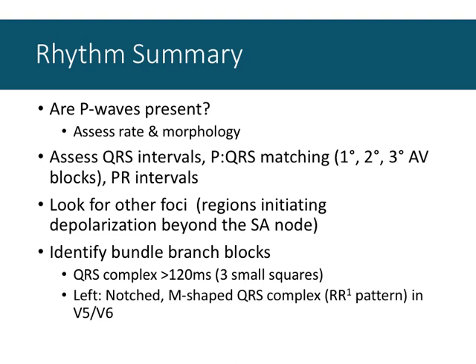So P waves, QRS waves, the relationship, and the regularity. Are they always related? Does the relationship change? Is there any aspect that's sometimes there, sometimes not there? And like I said, there's a lot more information on how to diagnose arrhythmias. There's a lot of different arrhythmias that we're not talking about. That's where that resource might come in handy. But we only really care about these main ones. And if I show you a 12-lead ECG on a midterm, for instance, there'll be an obvious arrhythmia. It'll be an obvious example, something that we've talked about in class a few times.